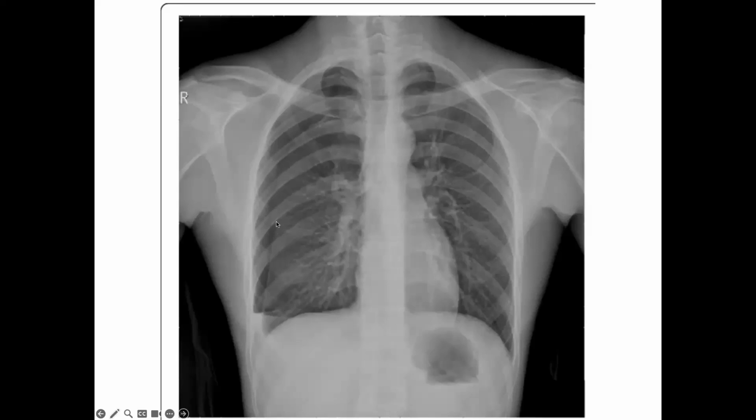So that is not the scapular shadow. I can't stress it enough in closing here that you need to compare the patient's right to their left. If you would have thought that was a scapular shadow, there's not one on the left side. So that tells me that's the outlining of the lung. That is the visceral pleura. And you can see the interstitial and vascular markings are very prominent to the periphery of the lung, but it ends distinctly right here in a linear pattern.